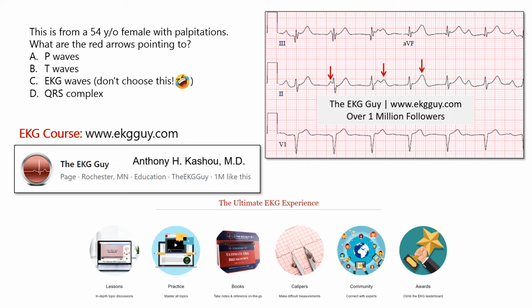I'm so glad you're joining us, and I wanted to touch on and review this question that we posted on our Facebook page. There were a lot of questions coming in, and a lot of good ones. This question is from a 54-year-old female that came into us with palpitations. The question here is, what are those red arrows pointing to? Those red arrows being these ones here. So what is it actually pointing to?